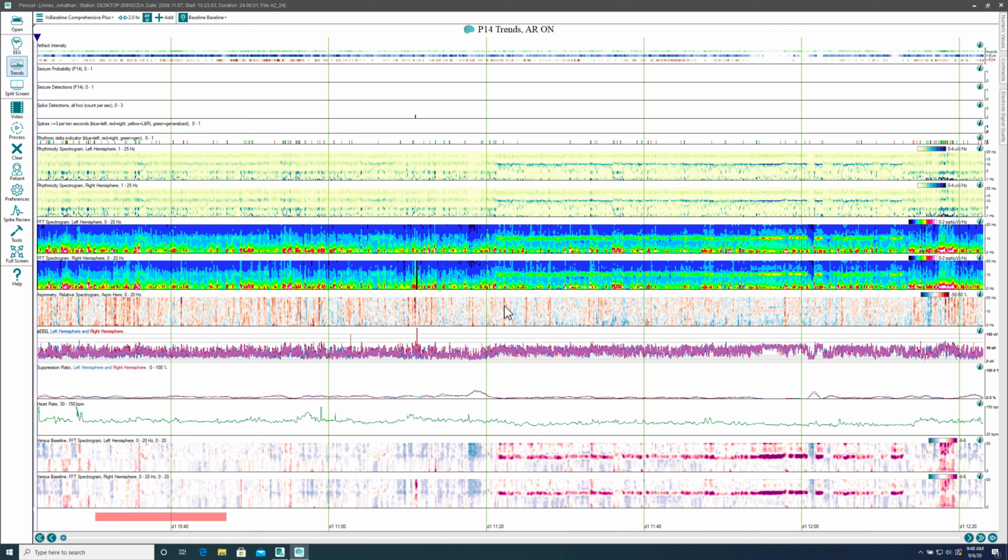There isn't anything notable on this page. The EEG is roughly symmetric here. The next is the amplitude integrated EEG display, again, where the left hemisphere is represented by blue and the right by red. Because the left and right are currently overlapping, it results in a purple color.